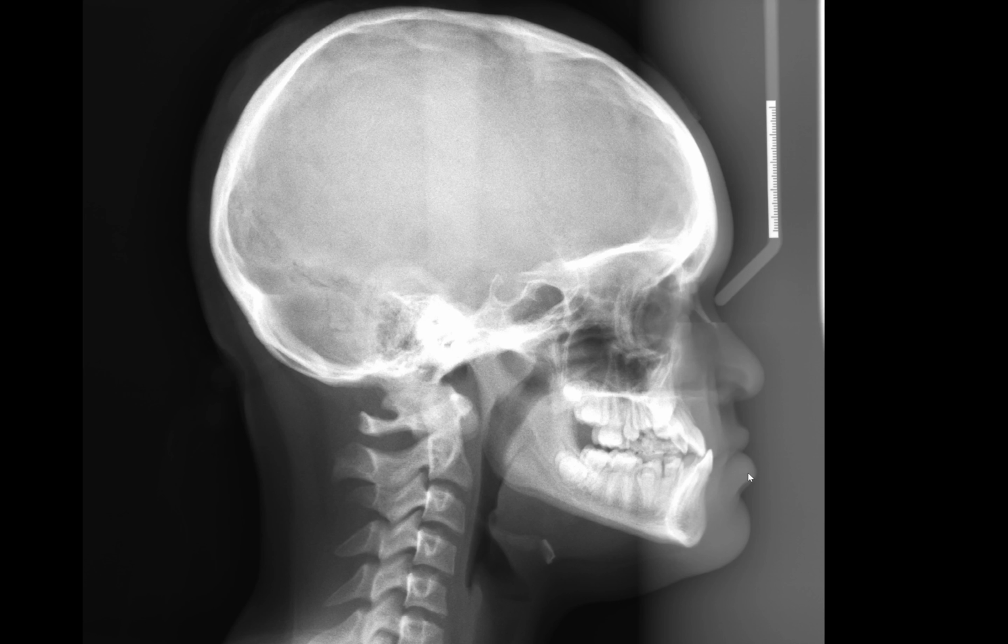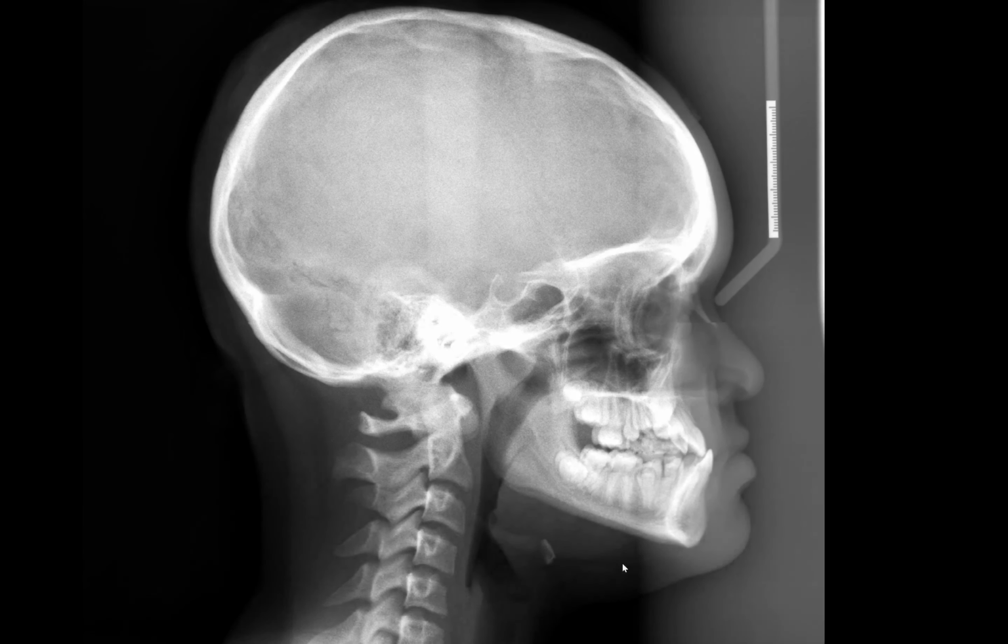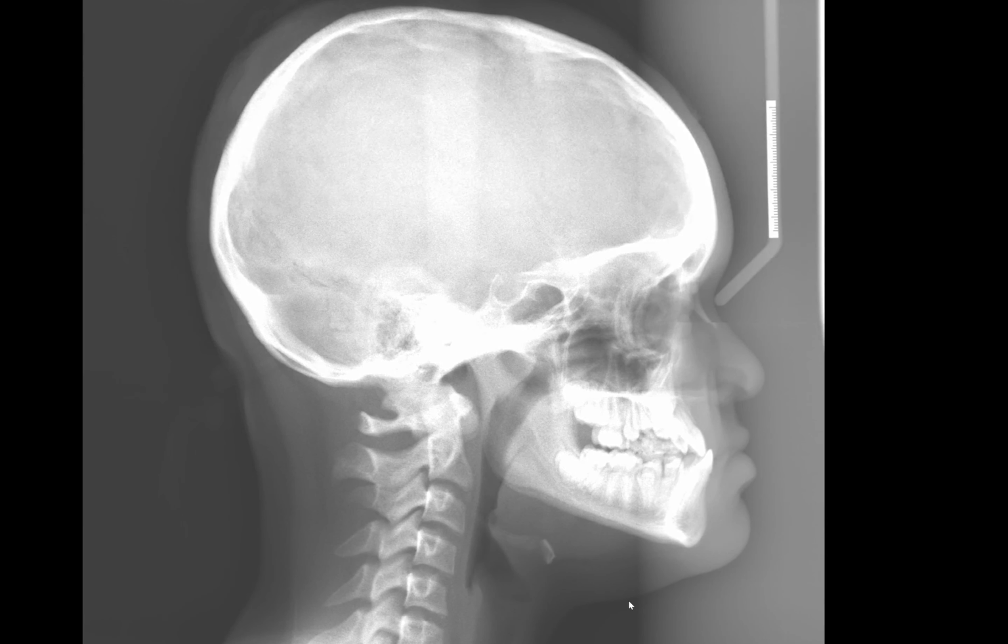of the use of filter and why we do it and how that makes a difference in terms of the image quality. So I think this part is very telling. You can follow the soft tissue very well, and right after this line, it's much more difficult to visualize that line.